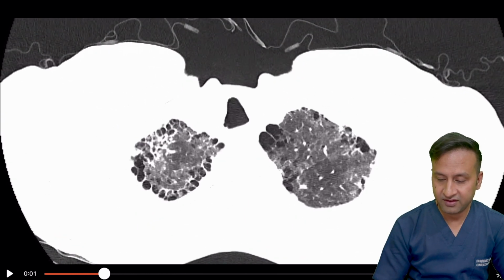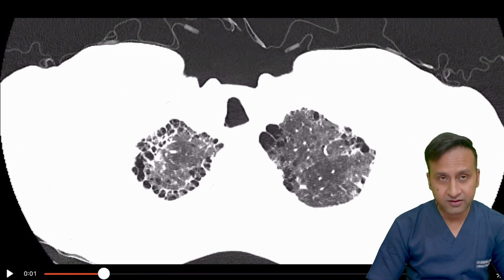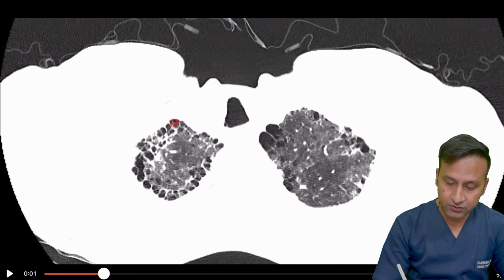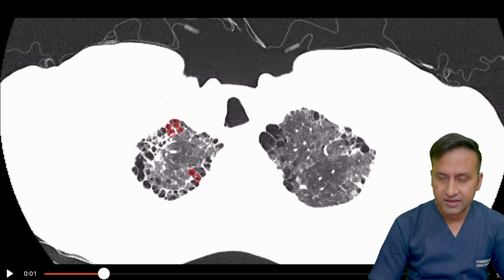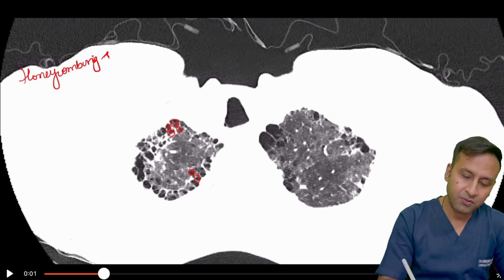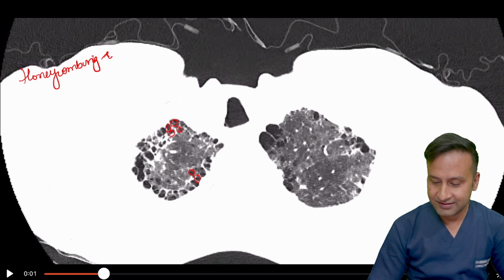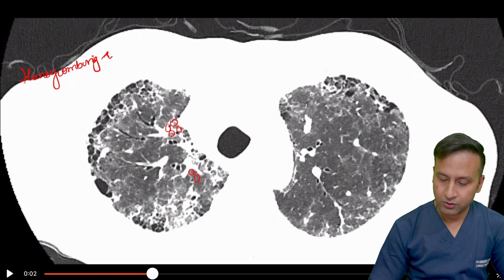So here what I'm seeing is, what is this? Does this look like emphysema to you? It doesn't, because I can see multiple layers. This is one, this is two, this is one, this is two. Again, this is one, this is two. Secondly, when the patient is a non-smoker, you don't think about emphysema. So we do have honeycombing. And whenever we see honeycombing, what is the first thing we think about? UIP.